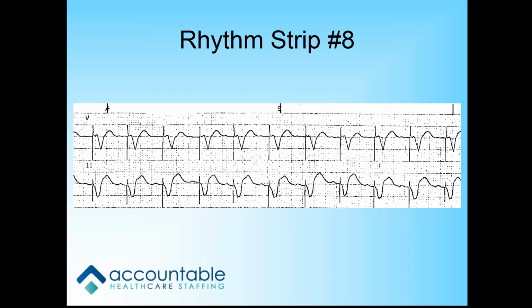Those are your pacer spikes. And that's what you hopefully will have your patient come back with after a third degree heart block. So when it inverts like that, that means it's been paced? No, look at the pacer spikes going straight up and down.